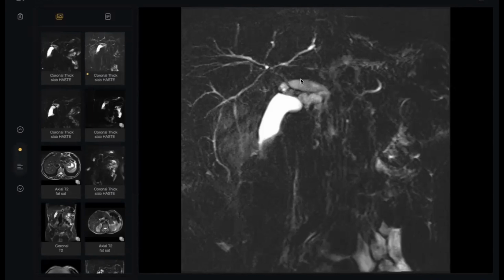You talk about the extrahepatic biliary tract. What happened here in the intrahepatic biliary radicles? There is mild stenosis, not dilated anyway, but some beading appearance, minimal. It is subtle. What is your concern? If it is beading of the biliary radicles, I'm concerned about primary sclerosing cholangitis.